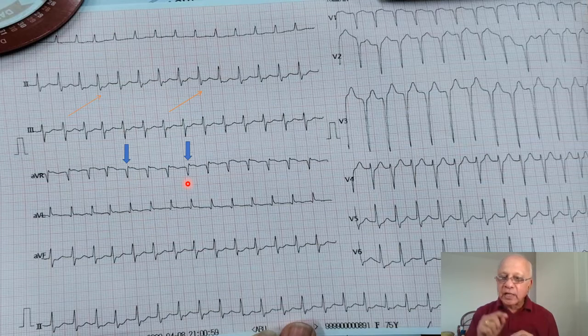You know that in reentrant tachycardia there is a re-entry inside the node, inside the atrioventricular node. And every time there is a re-entry and an impulse goes down into the ventricle, an impulse also goes up into the atrium. That produces a tiny P wave which you are seeing here. So this is the classical atrioventricular nodal reentrant tachycardia, or AVNRT, we call it that way. And these are called the pseudo S wave, and here it is called the pseudo R wave.